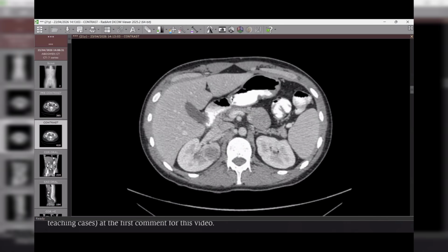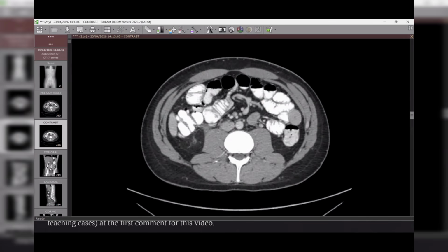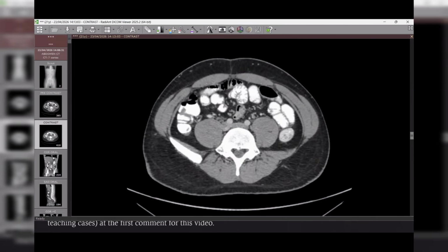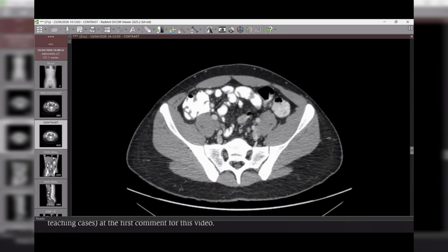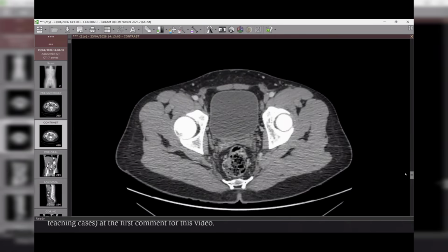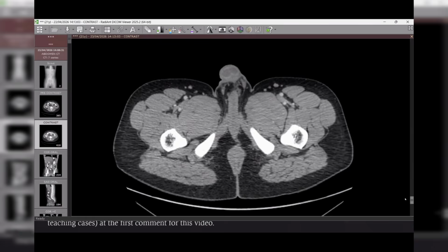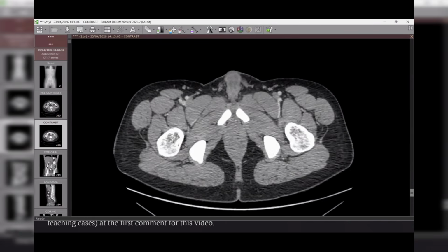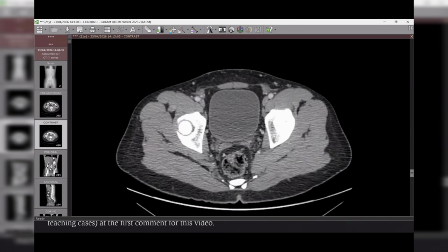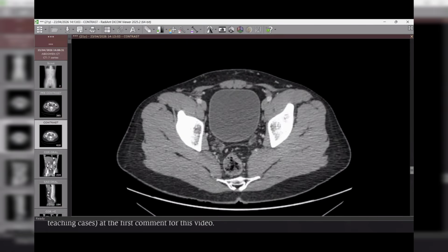But I need to ask you, what's more? Can I have a look again at all the cuts? I want to go down in the pelvis. Is there any value in seeing the lower cuts, the urinary bladder and the rest of the urinary tract? I just wanted to exclude any abnormality, any evidence of stones, any evidence of masses in the scrotum, or any abnormality in the scrotum.